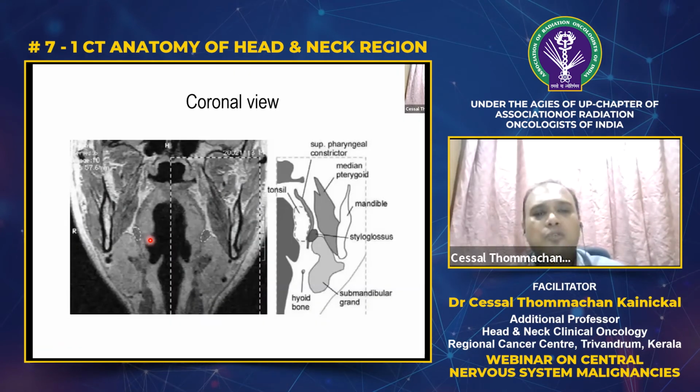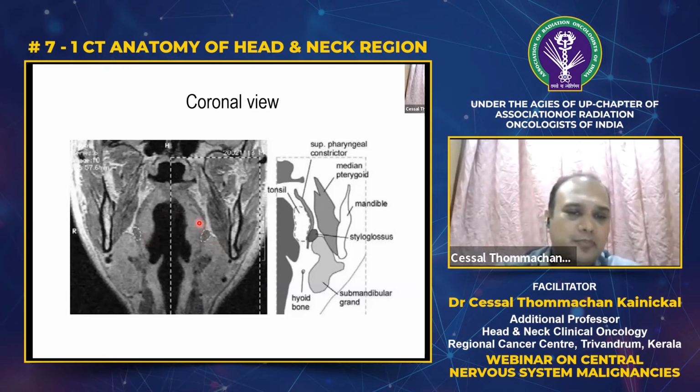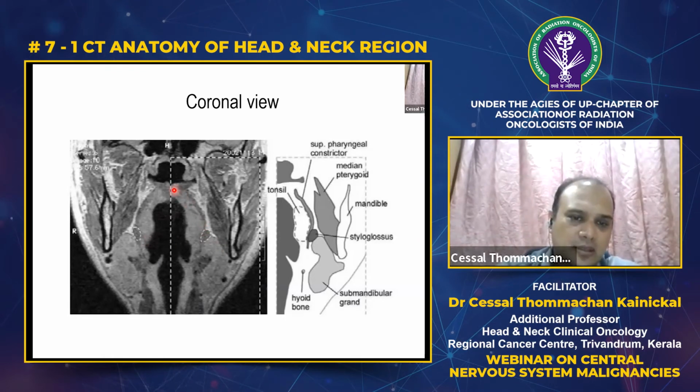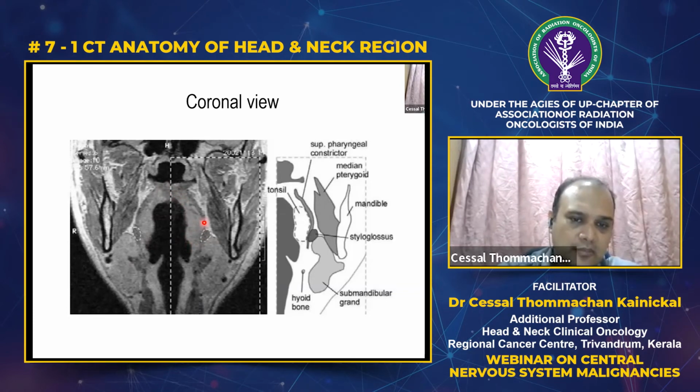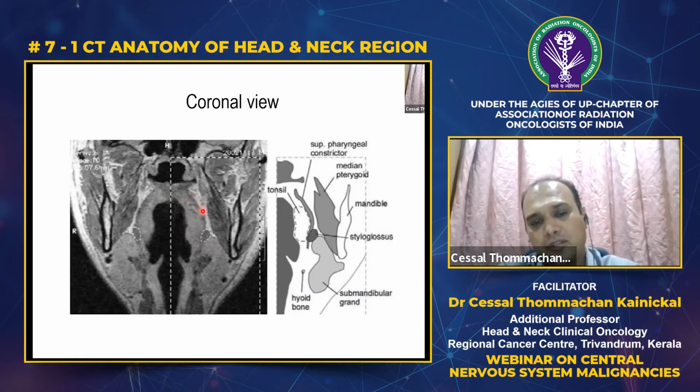Yes. So how will it look in coronal? It's very simple, but you need to understand. This is the tonsillar bed. Lateral to the tonsillar bed, what do you have? You have the constrictor muscle. So this is the tonsil.